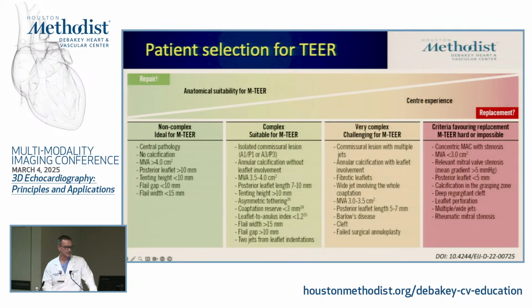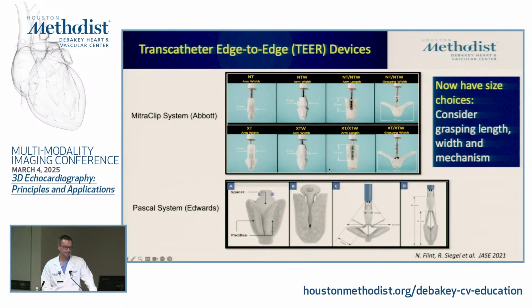And then just increasingly complicated, all the way to the red ones, which are heavily stenotic, very small diastolic areas, deep clefts. These ones you generally want to avoid. And then, most of what we do is either complex or very complex. This is the workhorse of the cases that we're getting referred these days, these two complicated areas. And the 3D is everything.